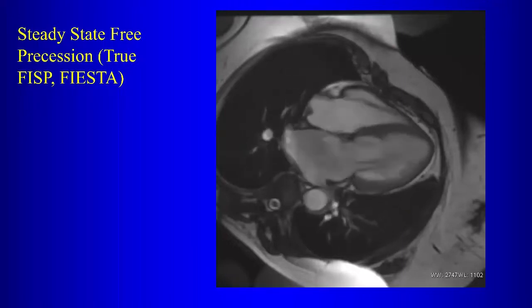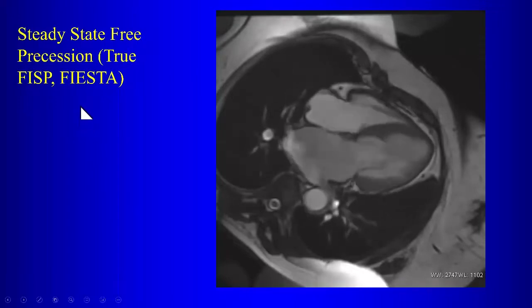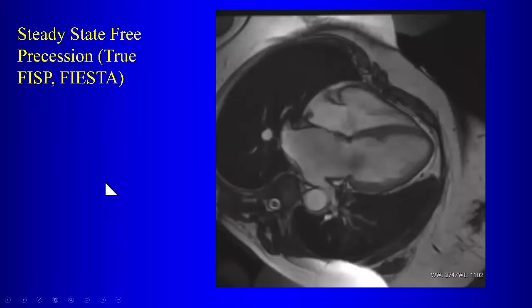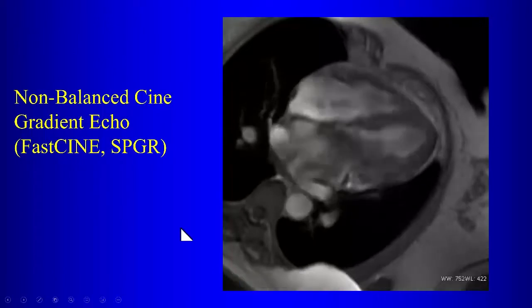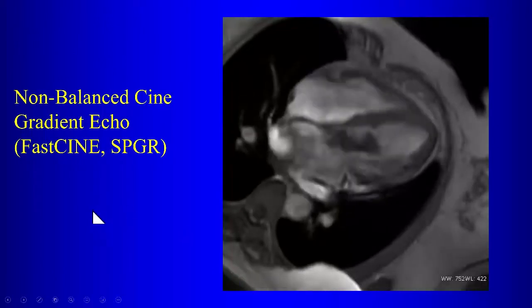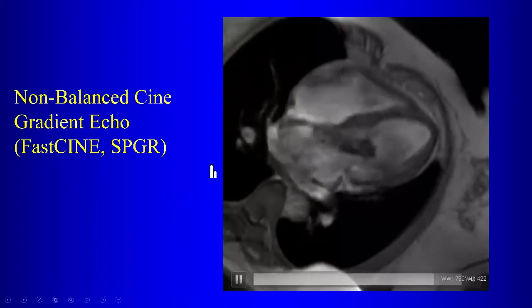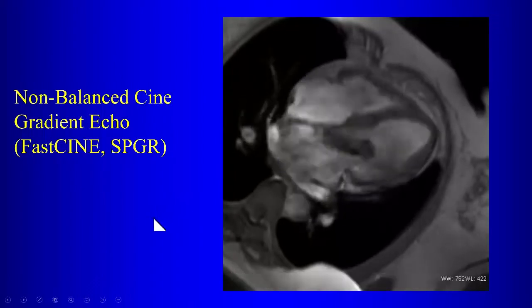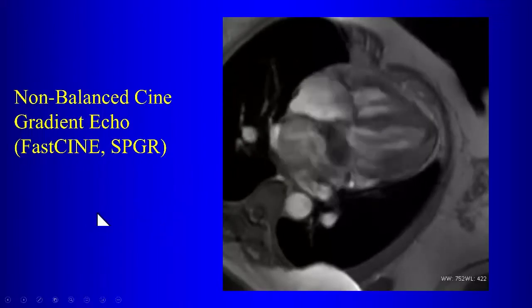Well, remember when we talked about imaging valves, that the sequence we use for imaging valves is SSFP, steady state free precession. But if you want a bright blood cine imaging sequence that can show you turbulence very nicely, what sequence would you use? No, spoiled grass. Those images are not as pretty as steady-state free precession, but they do bring out turbulence much better. Where you have a mass here, because of the turbulent blood flow around it, it shows up very nicely on this imaging sequence.